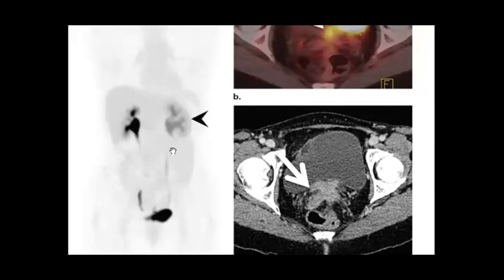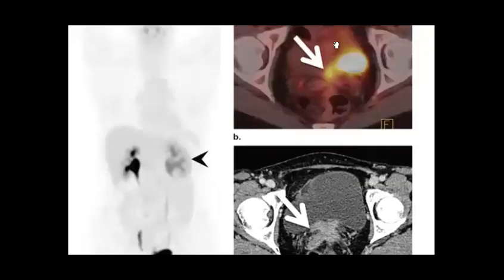And he was already treated. Yeah, invasion and recurrence. So after the patient had this, you can see clearly now that this patient has this tumor with FDG uptake, and it presents in the PET with different excretion by the kidneys, and then maybe you go to the CT to check, and you find that this patient already has this tumor which causes the obstruction.